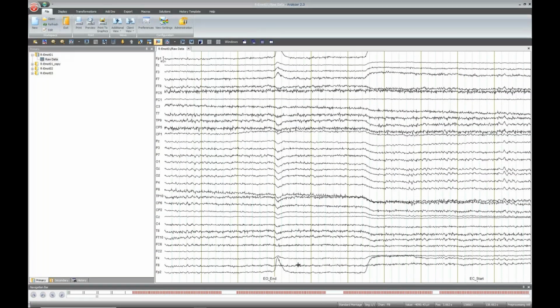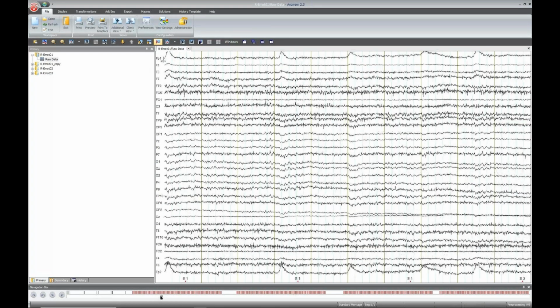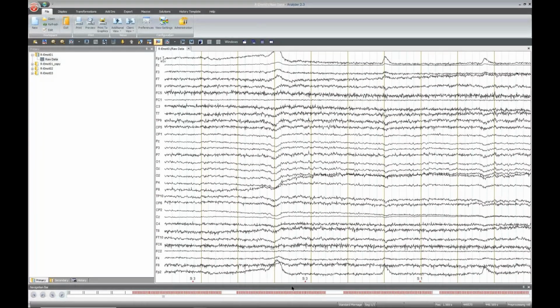You may notice then these 4 clusters of red markers. These are stimulus markers that show us when each one of the pictures was presented. They have different codes, with S1 that we see here meaning a positive emotion picture, and here we have other S3, S1, and so on. These come in 4 clusters for the 4 blocks.